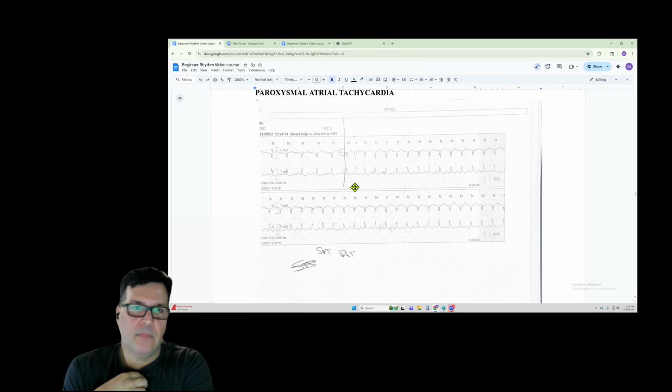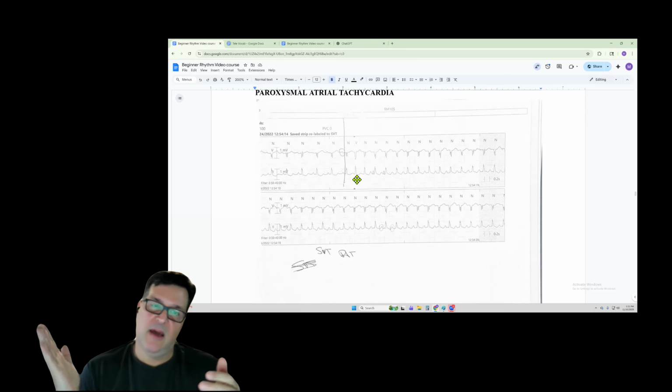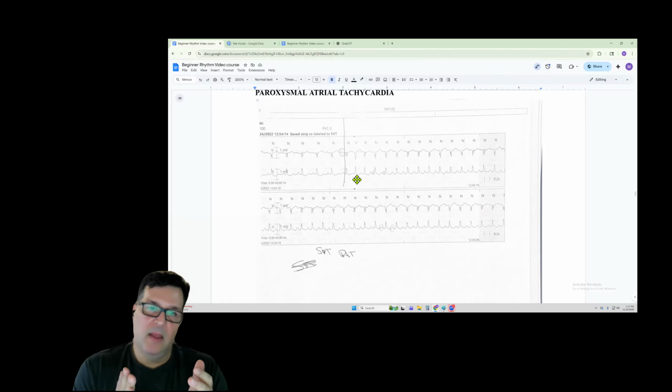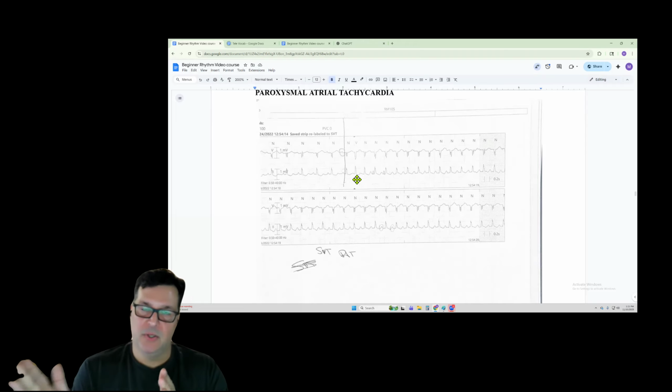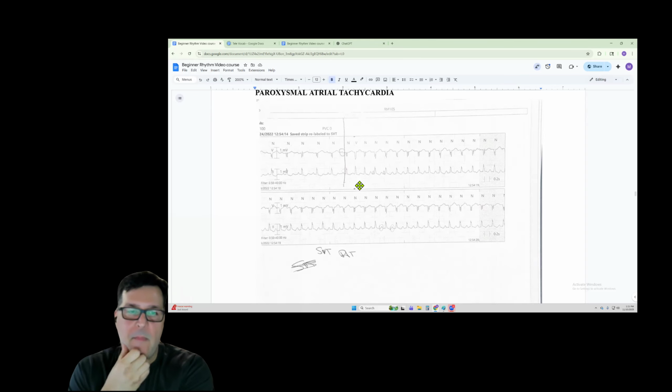You're really emphasizing that sudden onset. Yes, heightened and staying heightened. Because like before with PACs, you have that one early beat, and now we just have a bunch of those early beats in a row. You can have short runs of it, like 2, 3, 4 PACs in a row. This one just happens to go on. So SVT can be just a few early beats suddenly and then return to normal.